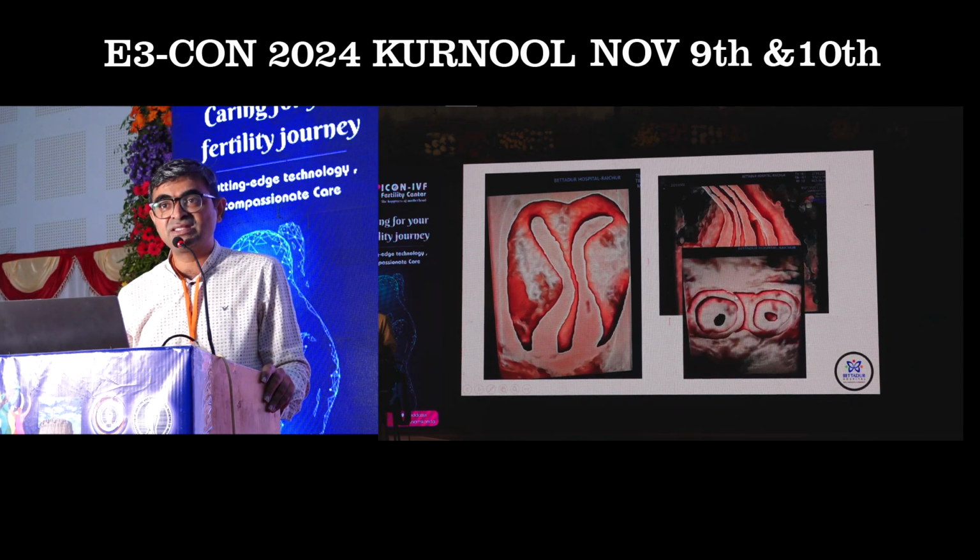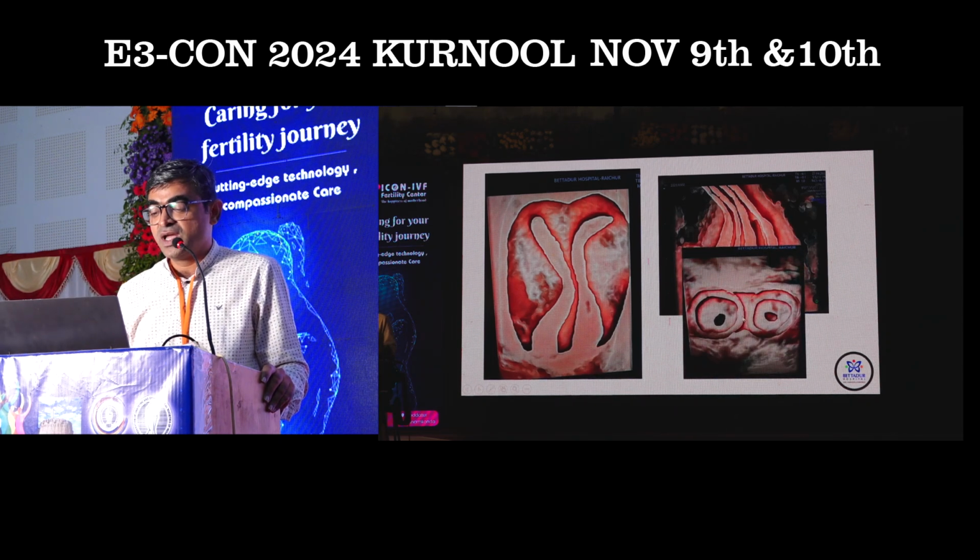Why am I giving these images to my surgeon is because the management options will definitely differ. Some will never cut this septa, because for us to have a good uterine volume, we need a good corpus for the fetus to grow. Definitely only cutting the upper part is enough, till the septa till here. Don't cut this cervical part. They will be more associated with cervical incompetence.